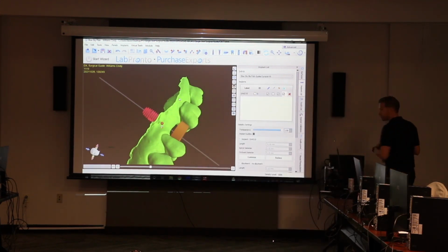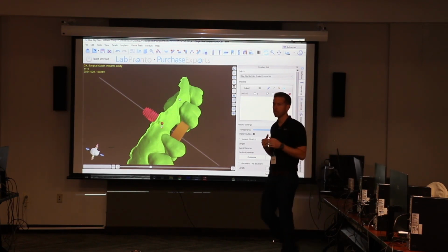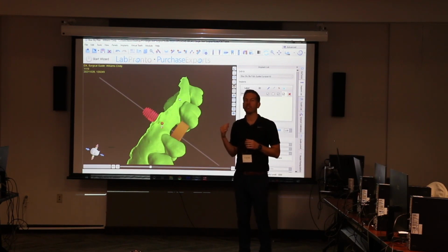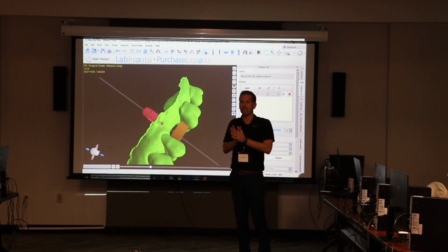So Matt, you changed your offset. Did you change your diameter too? Yes. Okay. Yep. It's just whatever you're calibrated to, you'll change it every time to 5.2 or whatever you decided your machine's best at. Yep. Because it defaulted to thinking I was using a sleeve. I took away the sleeve, so I had to raise it 0.5, and I had to bring it in to meet my printer. Yep.